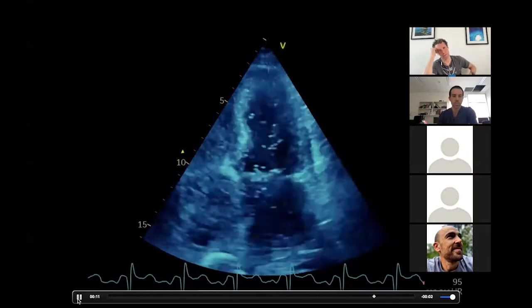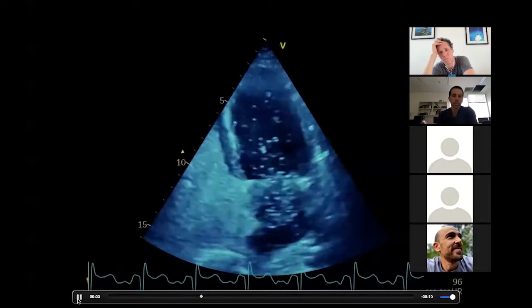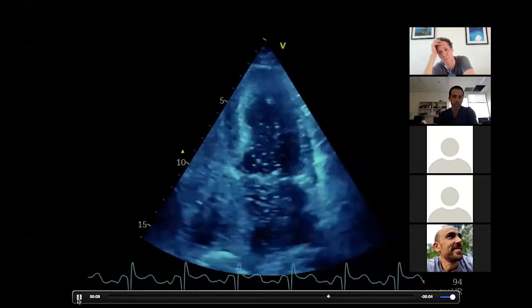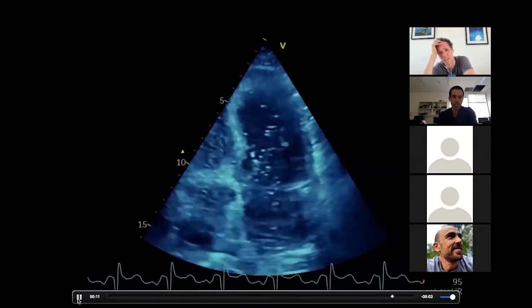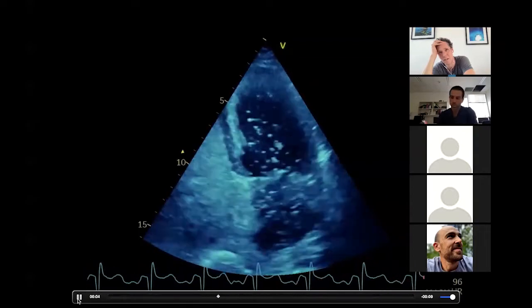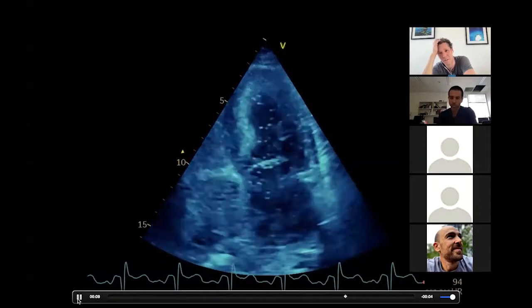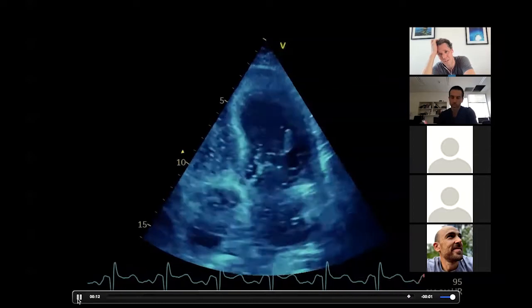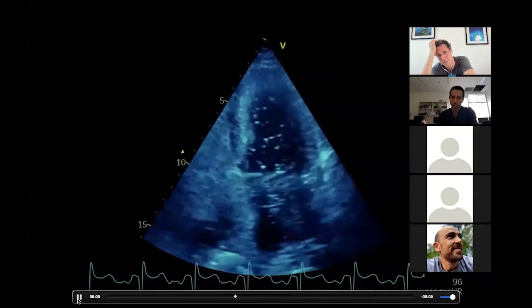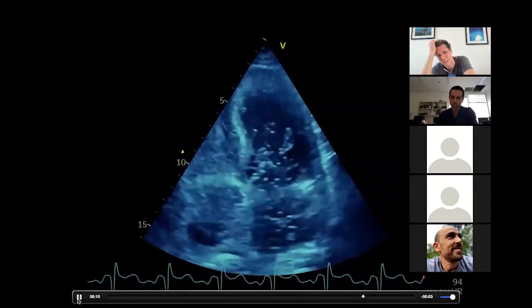And so, what's the significance of that for this patient? It signifies the raised right atrial and the ventricular pressures. Yeah. Anything else? Clinically, why is it important to know about this? It's important because of many factors, patient-related and ventilator-related factors. Patient-related factors, patient is hypoxic and probably hypercarbic with pulmonary hypertension, which is probably because of ARDS, ventilatory settings. If there's excessive PEEP or high ventilatory pressures, with the volume and the barotrauma can cause opening of the foramen ovale with the right to left shunt.